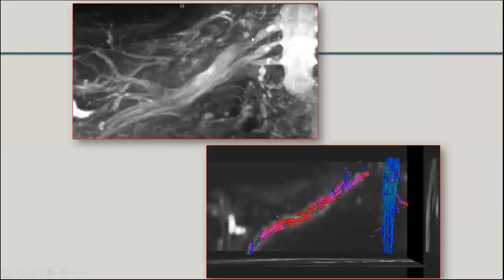Or sometimes they're like this, just nerve thickenings, nodular thickenings. And the tracts are mostly maintained because the tumor cells go around the nerves, disrupting the tracts partially, but most of the tracts are maintained. That's how lymphomas are, perineural spread.